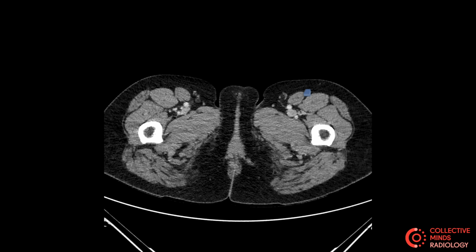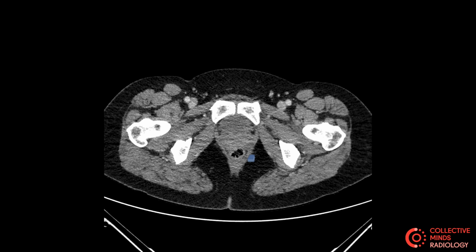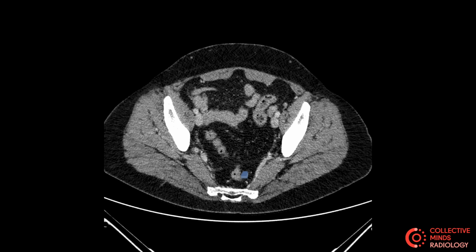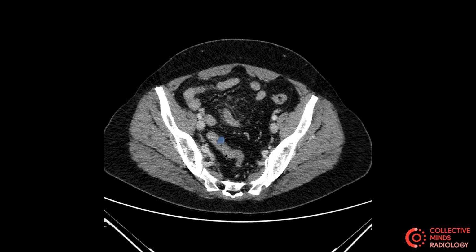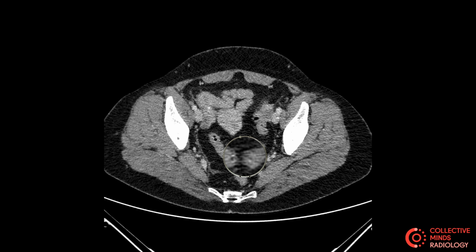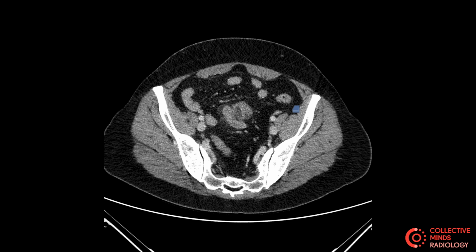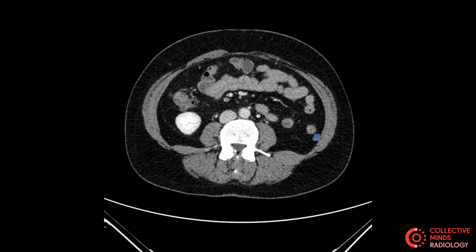So let's go from the very, very bottom, quite literally, and work our way up. And we can see that the sigmoid colon starts around here, and we start to veer off around this region. That's the bowel. Let's keep following, and it curls around this way, and then we keep going. Right around like this, and then curls across this way. And I think we're going to be coming up to one of our constants, the descending colon. That's the descending colon. Let's come up.